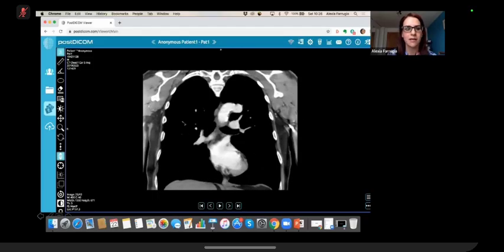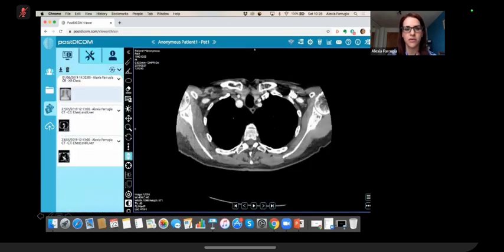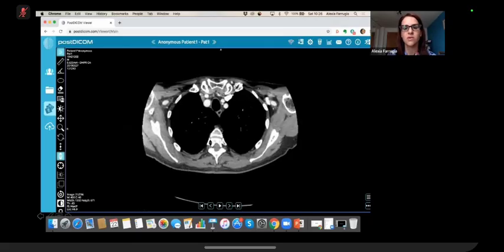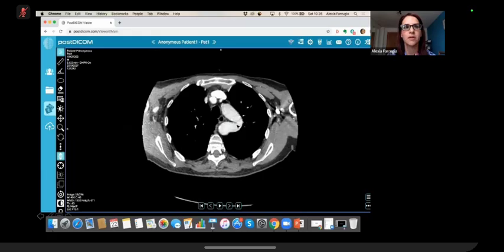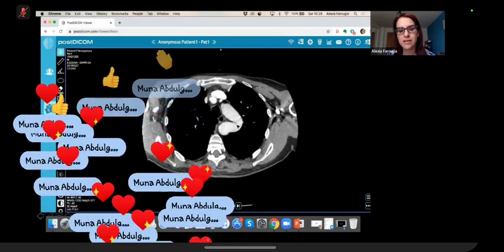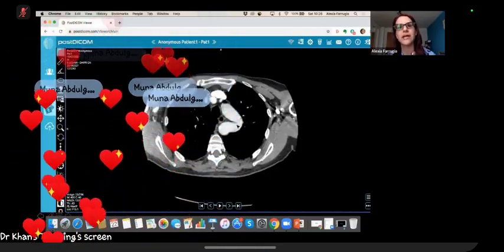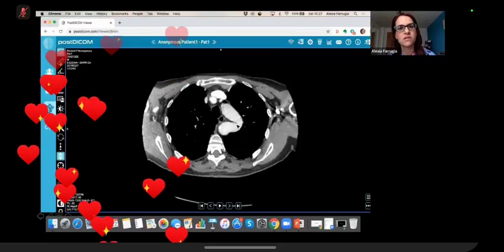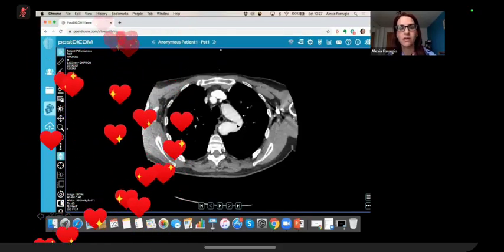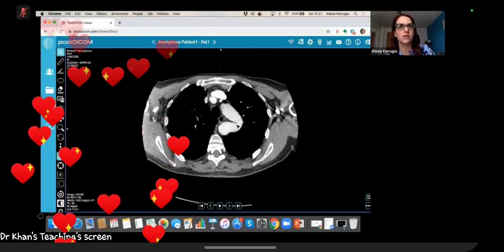Right. And typically, this happens at the level of the isthmus, which is also the site where coarctations happen most commonly. But in this case, there is no evidence of a collateral circulation. There is no dilated or ectatic intercostals or internal mammary arteries, and there's no rib notching. So the findings would be consistent with a pseudo-coarctation.